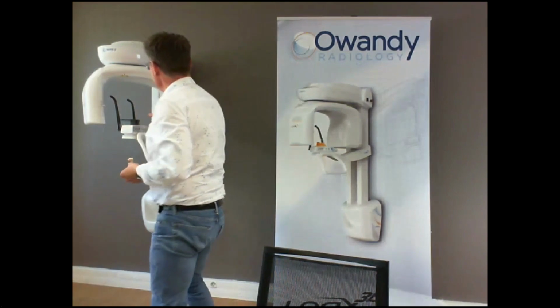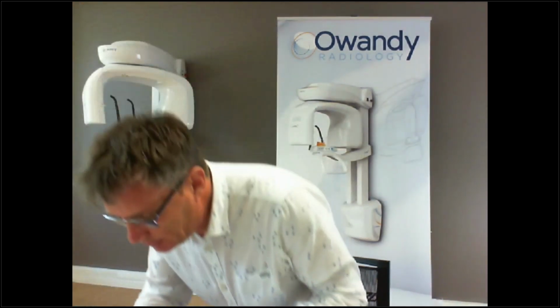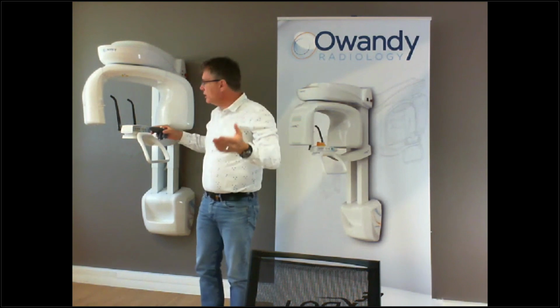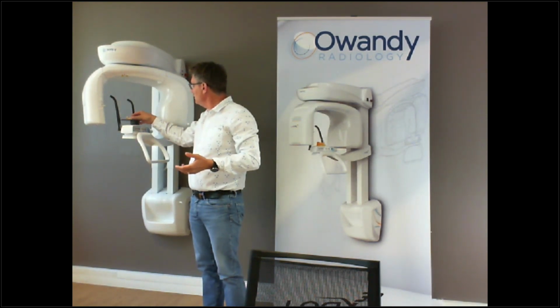Well, it's very easy. On the device, sometimes people, they does not know that we may use like a small plate like this. We just put the model on the plate. We put the plate on the device itself.